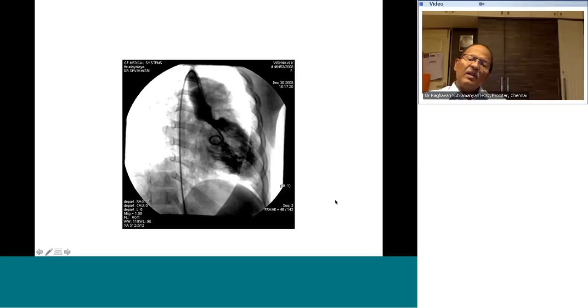Okay, this is the diastolic frame. Now, can you see that the LV outflow is narrow and elongated, and you don't see the atrioventricular septum here. The mitral valve posterior border is here, but the anterior border is placed quite anteriorly and superiorly here.